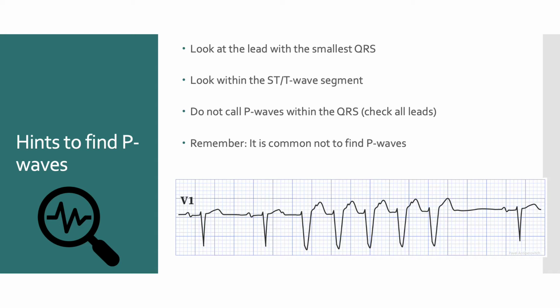And finally, it's important to template. So in this particular example, you have a sinus QRS and you see this T wave. And here you can see a high frequency deflection within this T wave, which is almost certainly a P wave. And remember, it is okay not to find any convincing P waves on a tracing. It just means you can't use the strongest tool in your toolbox, which is the AV relationship. But you can use other tools available to you and just move on.